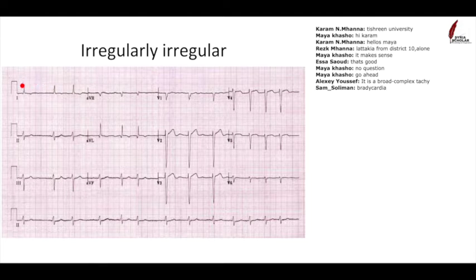So if you took this section, this could be a bradycardia, where there's less than 60 beats a minute, but that's looking at the rate. But we're looking at the rhythm. Overall, the rate is normal in this heart. It's not a bradycardia, but if you just took this bit in isolation, you could think that. But the rhythm, is it any you've ever heard of? All right, I'll let you guys know then.